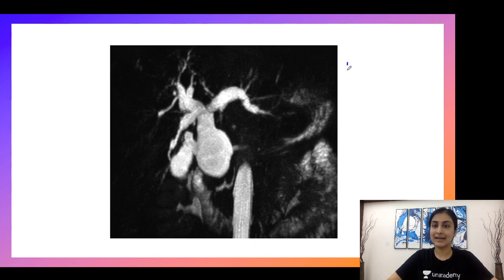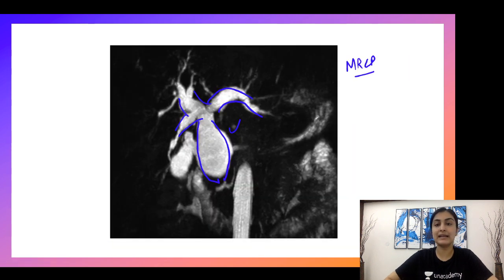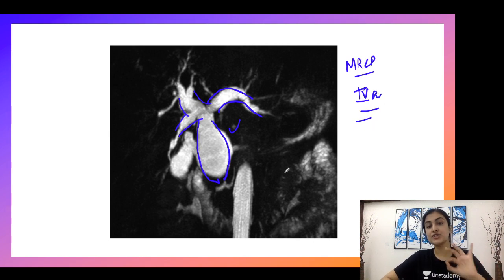So again, this is our MRCP image. Can you all appreciate this MRCP image? What are we seeing now? That now there is a fusiform dilatation of our extrahepatic biliary radicals as well as the intrahepatic biliary radicals. Is this clear? Our extrahepatic as well as intrahepatic, correct? You see that these are all so very dilated. When we compare it with our normal ducts, see how they are dilated completely. So again, this will form intrahepatic plus extrahepatic, makes for our type 4A. Alright, so this is our type 4A choledochal cyst. I hope this is making sense.